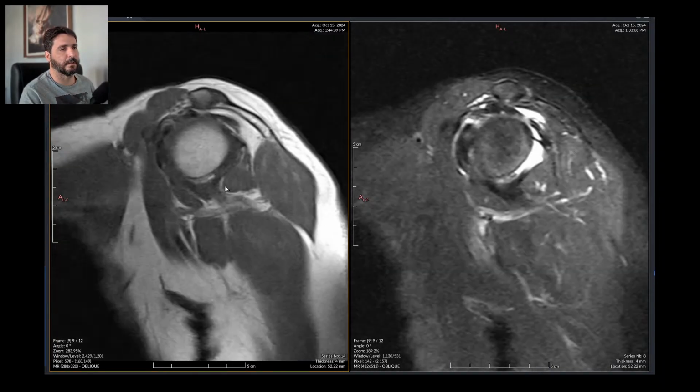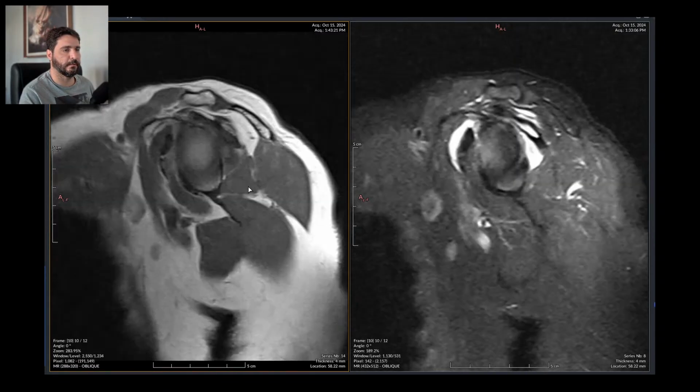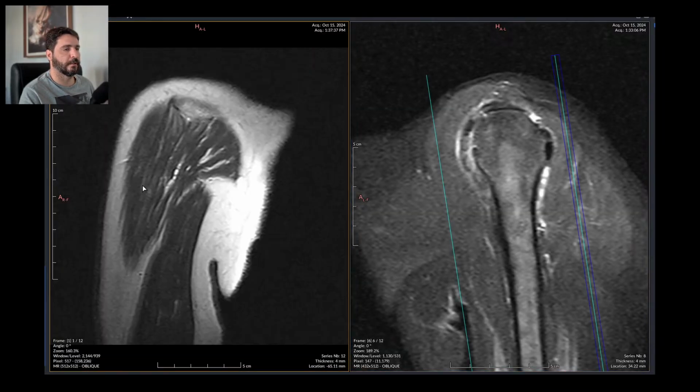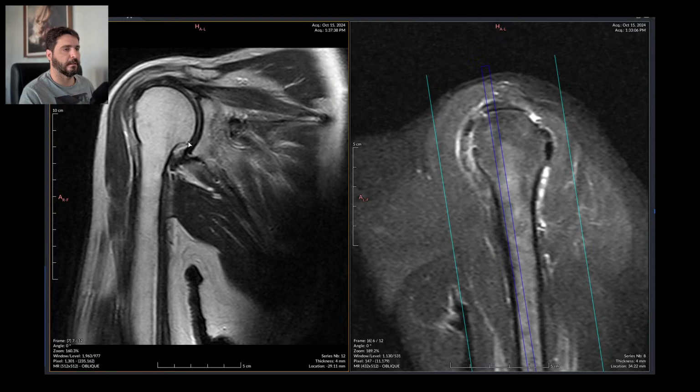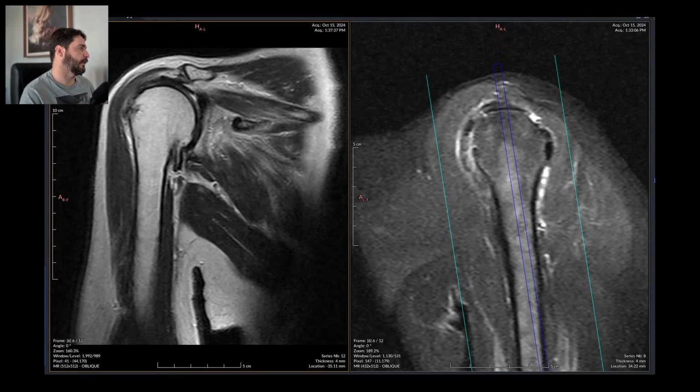There is mild arthrosis and synovitis of the acromioclavicular joint. There is also hypertrophy or atrophy and fat substitution, fat infiltration of those muscles, and the same degenerative signs. See? Osteophytes, narrowing osteophytes. This is also arthrosis all over the place. So let's just see this through.